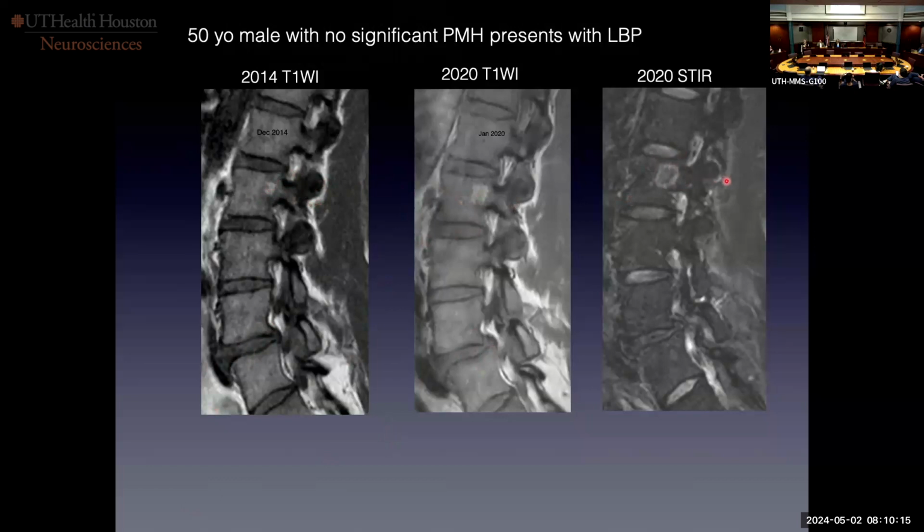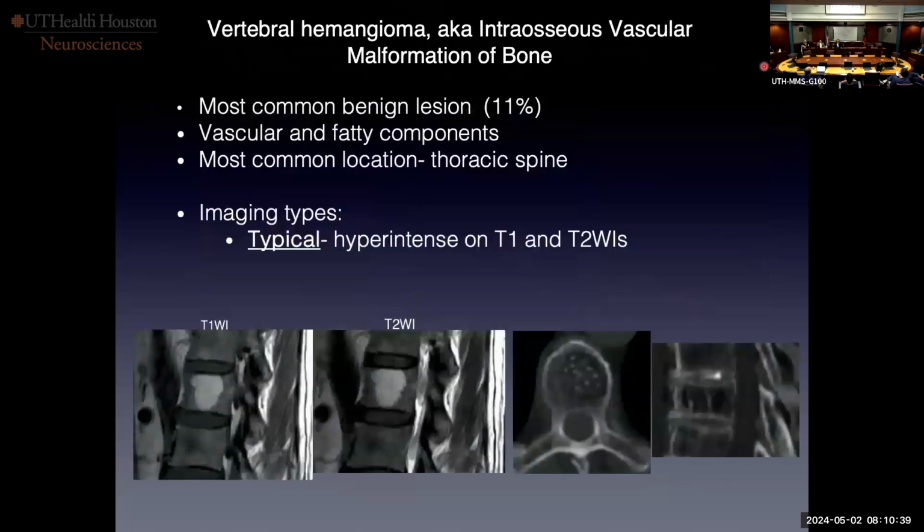So the neurosurgeons are like, okay, but it has a halo. You said halos are bad. But it starts with the T1 weighted images. It's uniformly high in signal. It's fat. It's hemangioma. And oftentimes hemangiomas, because of the fat, they can suppress on fat suppression images if they're largely fat. And they often have this little falsely concerning halo of edema. And it's the angiomatous component.